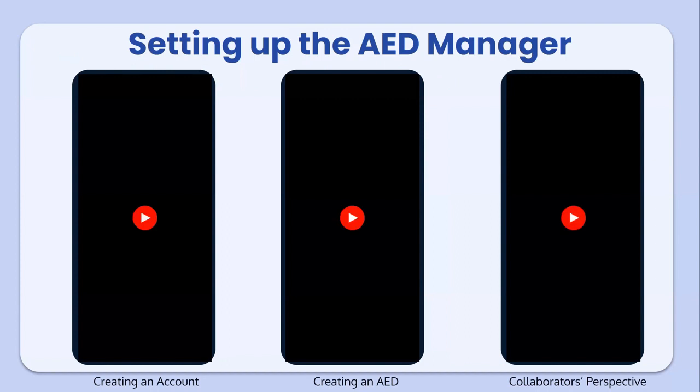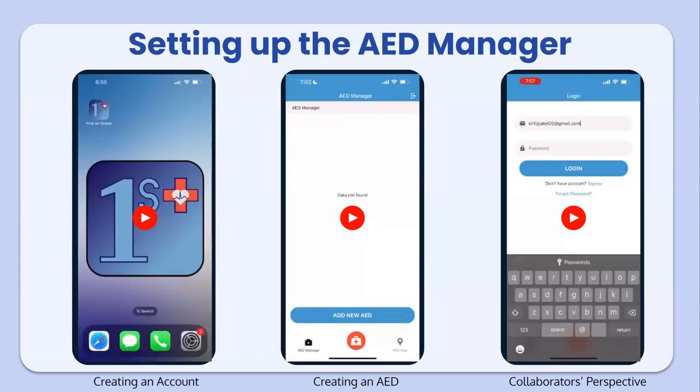I'm going to talk us through creating an account, adding new AEDs, and then how it would look if you have multiple people working on this maintenance for a single AED and or multiple people monitoring AED maintenance. And then finally, how do you actually perform maintenance checks when they're necessary?